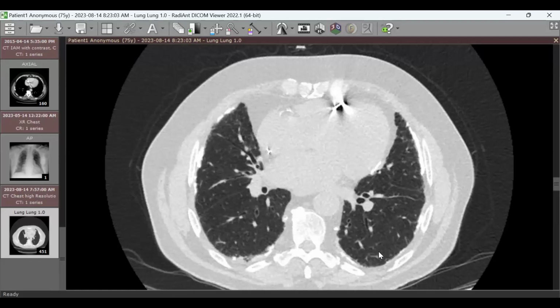If it is not idiopathic, it could be either connective tissue disease related, or occupational, or even asbestos-related asbestosis. Give me one word. Asbestos. I don't have the exact history of this patient. If there is any asbestos exposure, we call this asbestosis. This is an asbestos-related interstitial lung disease. We don't have the exact history.